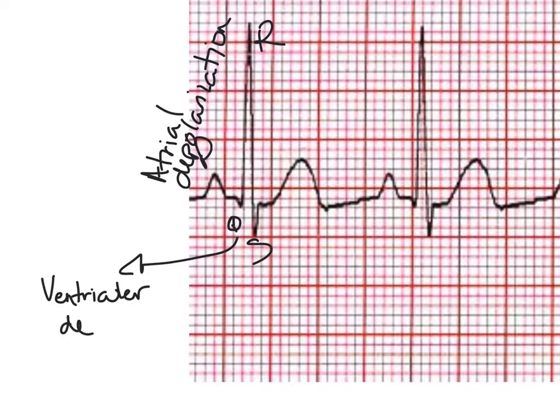Okay? Again, we have the word depolarization, and I want you guys to think of preparing the chambers, in this case the ventricles, to contract. They're not contracting, they're preparing to contract. Okay, that's what the QRS complex means. It means ventricular depolarization.